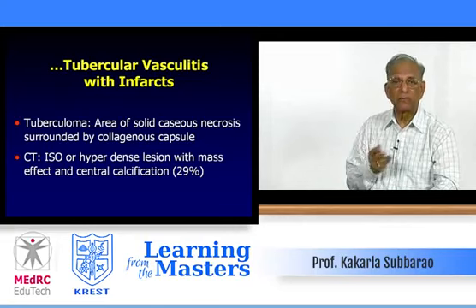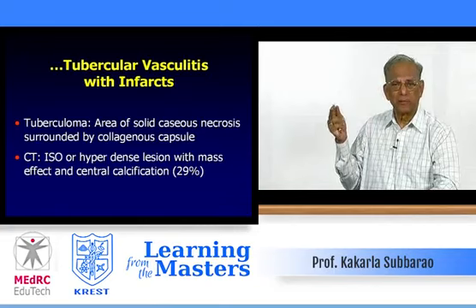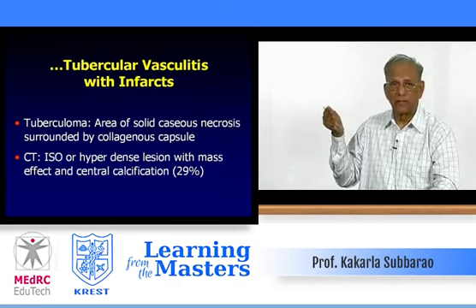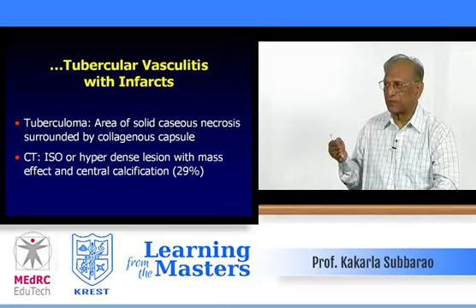Whereas if you take plain films of the skull, in olden days, we used to see calcified tuberculomata. But today, seeing calcified tuberculomata on the plain film is rather rare. It can occur. It may be silent and then it may calcify. Same thing in tuberculous meningitis also. Occasionally you can find calcific plaques of the meninges, indicative of healed meningitis.